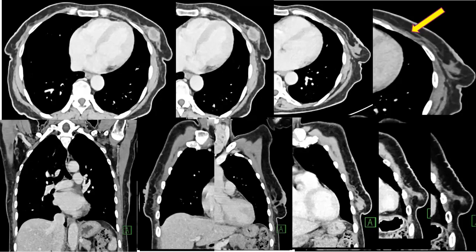That is why infiltrating into the apex of the pectoralis as well as the chest wall. If you have seen here, even there is some tethering, an area of enhancement at the apex more than the rest, and just focal thickening. These are the features that signify the involvement of underlying structures. Okay.